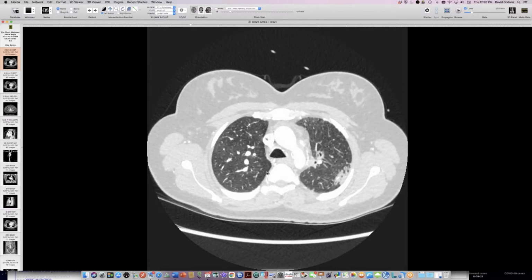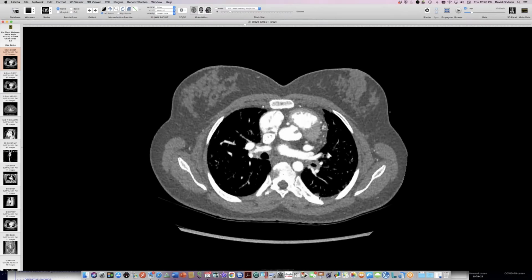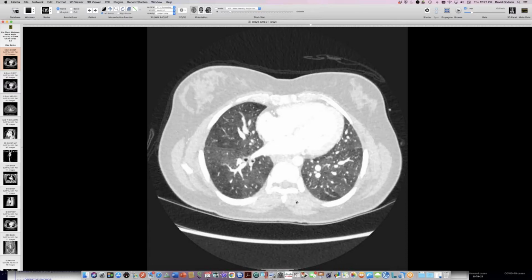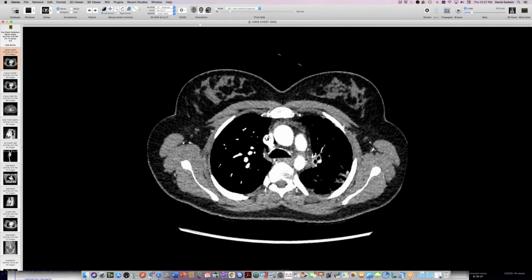I'd like to show you this woman here who is 48 and only 4 feet 5 inches tall. She has some distinctive facial features and pretty severe aortic stenosis. She had a bicuspid aortic valve, and she also has irregular perfusion of her lung, so she's got some mosaic attenuation. She didn't really have a workup for airways disease, but she does have some obstructions of pulmonary arteries.